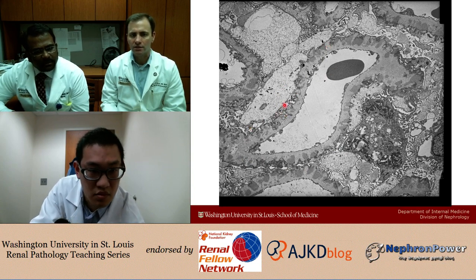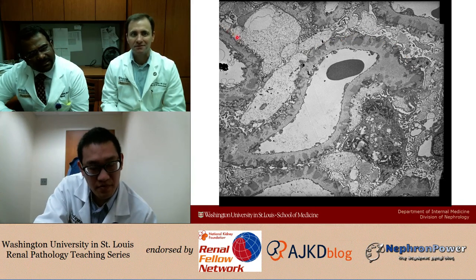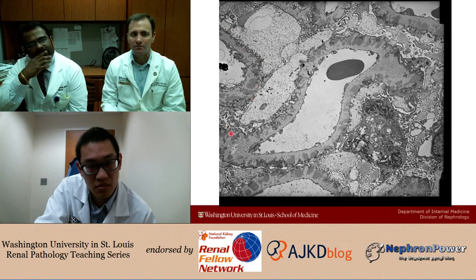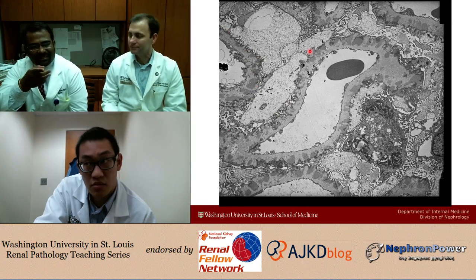So what else are we seeing here? What about the podocyte foot processes? Well, they don't look good. They don't look good at all. I mean, where are they? Effaced. Right. Yeah, that's good. Go with your instinct. Yes, they're gone. They're effaced. Again, here as well. So does that mean this is minimal change on top of membranous? No, very good. It's membranous.